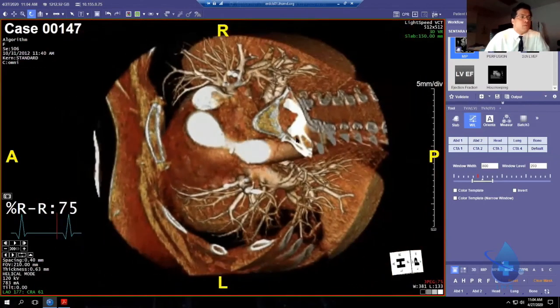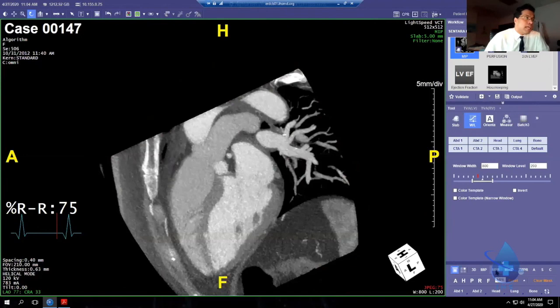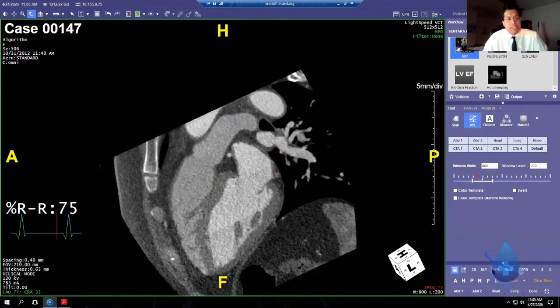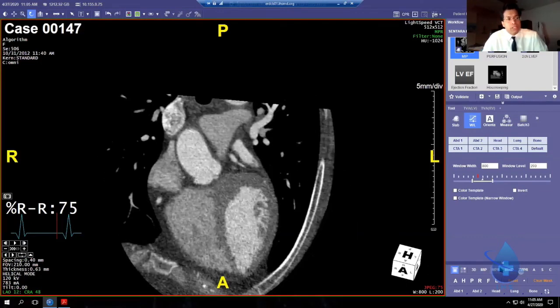These are viewing algorithms. They take the same data and apply complex computation. Okay, the nominal data, the source data is MPR. That's the basics. So when I click MPR, there's nothing more granular or source data than the MPR. That's the basic CT scan.